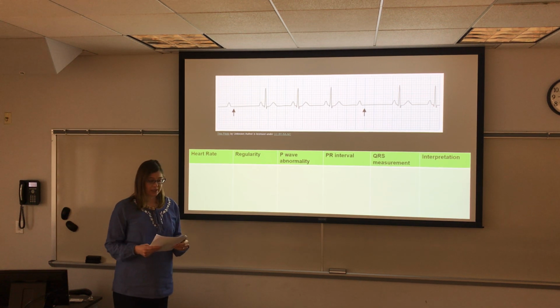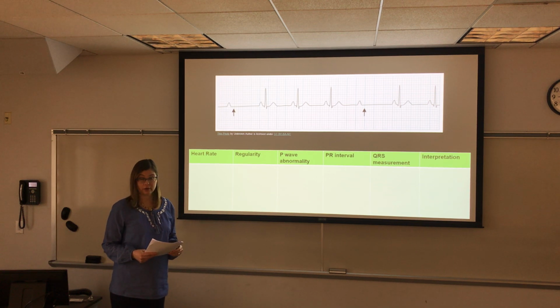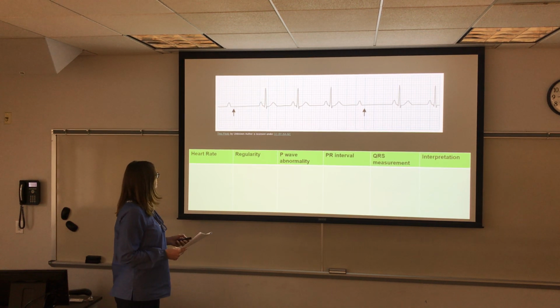So our next patient is Mr. Achy Breaky. He's a 55-year-old male with a history of coronary artery disease. He's been admitted for an acute anterior MI. Let's look at his strip.